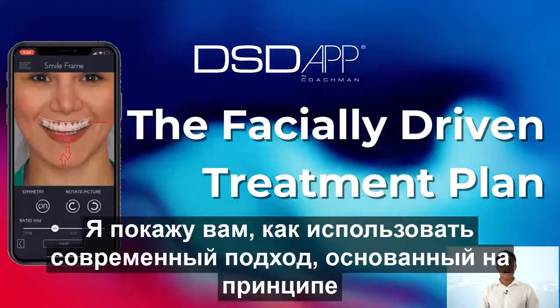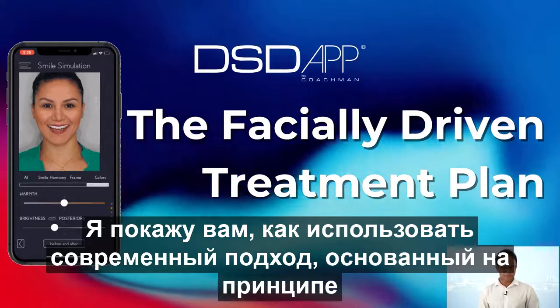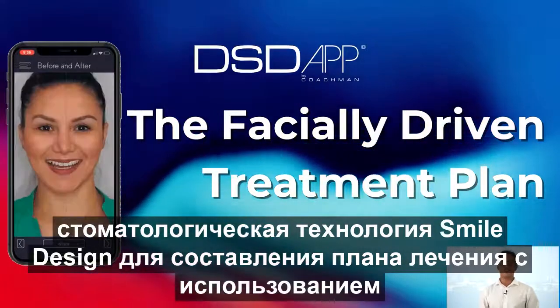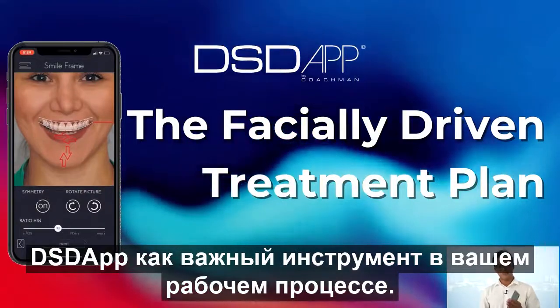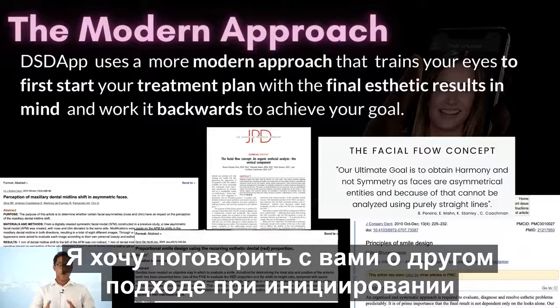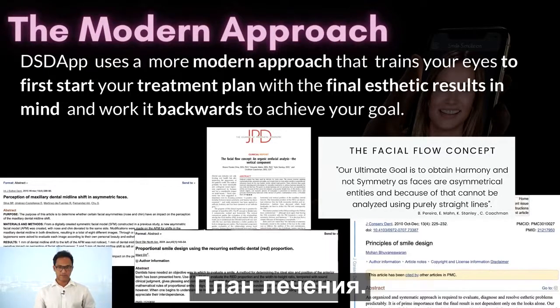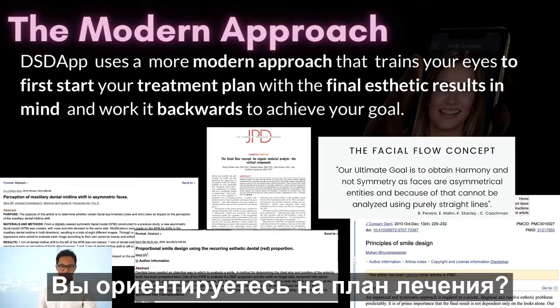In this series, I will show you how to use a modern approach based on the principles of smile design and dental technology to initiate a treatment plan using DSD app as an essential tool in your workflow. I want to talk to you about a different approach when initiating a treatment plan. That's why we call it the facially driven treatment plan.